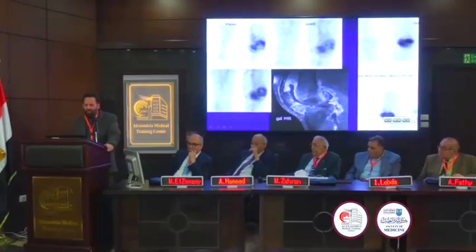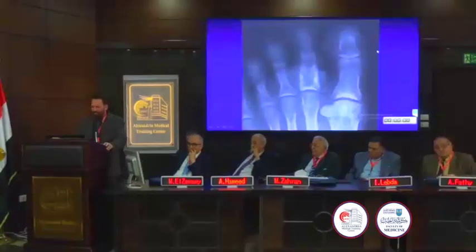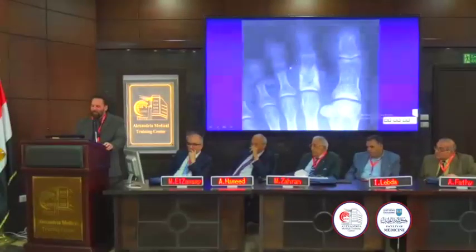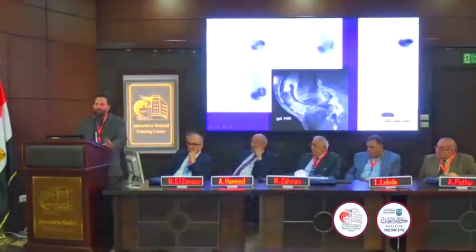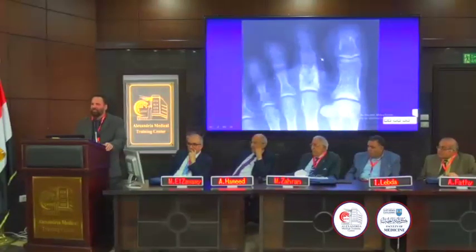In septic arthritis, we'll talk about this in some detail. You'll see a joint effusion, enhancement, increased blood flow, increased delayed, but the delayed should be warm, not hot. So anyone knows what this is, and the most common organism here would be staph followed by gonococcus. And how about this? Anyone know the organism? Very good. Who said it? Very good. Tuberculosis. Have you seen this in Egypt? Oh, well, you're much younger than me. I've seen it twice.